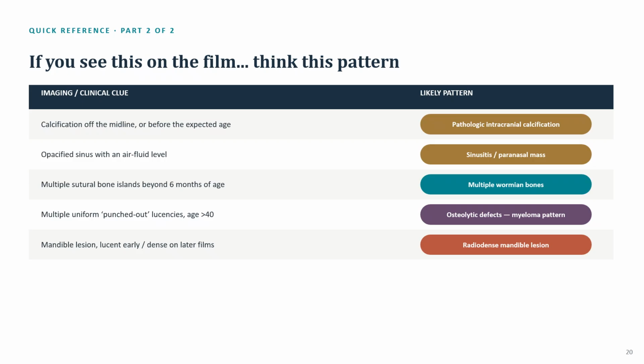We're not diagnosing the patient, but if we can identify that something looks abnormal, it might get the patient to their follow-on treatment faster, especially if we can bring it to the radiologist's attention prior to allowing the patient to leave. So again, looking at the patterns, not necessarily trying to memorize or recognize the patterns, but just have an idea of what these patterns look like, coupled with the clinical history and also the patient's age and some of the locations of these things can help us just be better at our job.